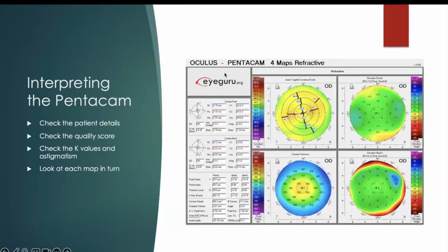There's a nice report on iGuru that is helpful for you to look at as well. If you want to go across to their website, they have a nice report on how to interpret the Pentacams. So you're going to start off by checking the quality score.